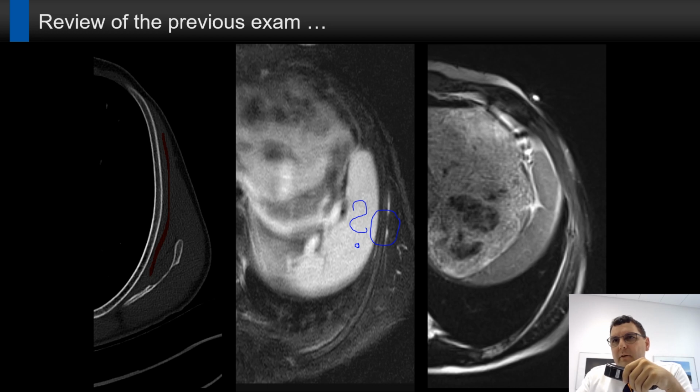This is the rib here. You can see there is no signal intensity change in the rib at that day, and 12 days later we had the fracture here. So my conclusion was that rib fractures are very difficult to see, even if you know that they are there. I will be super careful in the future with rib fractures.